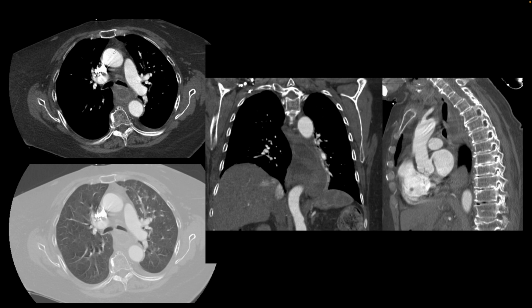This next patient has a large hiatal hernia that was causing PE-like signs and symptoms, best seen on this coronal image. So these patients can have distension and mass effect from this hernia. It is most of the stomach that is sitting in the chest instead of in the upper abdomen.